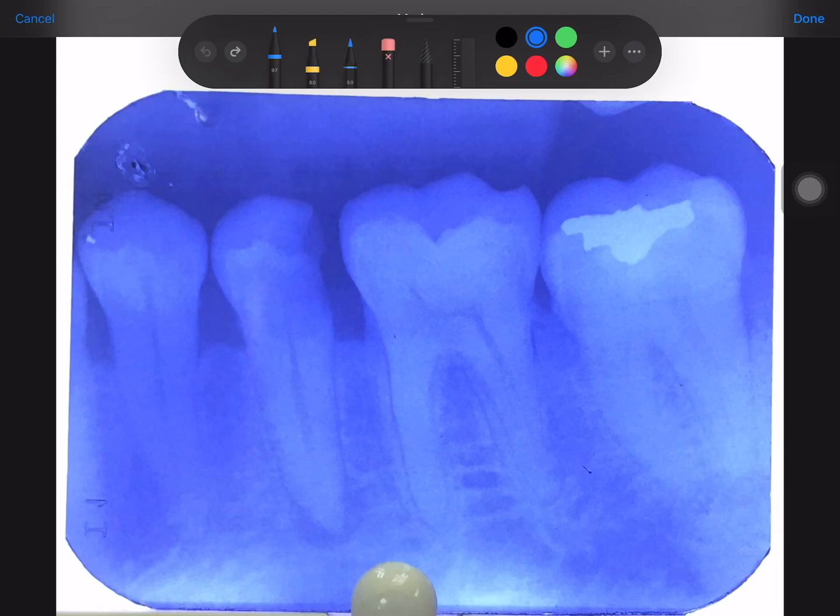This is a mandibular radiograph, which is a tooth that we can see. Teeth 4, 5, 6, 7. Assuming that it might be there because you can't make out the dot, it must be the fourth quadrant. So this must be 4, 5, 7. So which is our tooth of interest? 4, 5. Yes, 4, 5 is our tooth of interest.